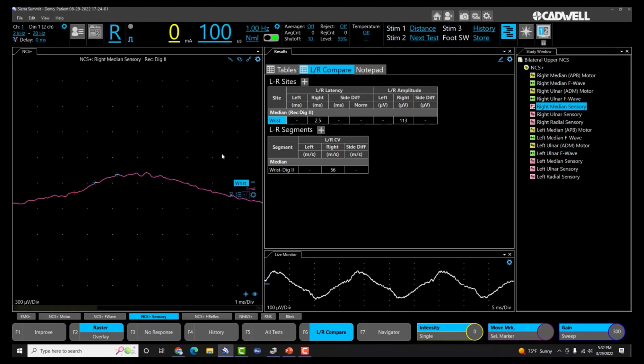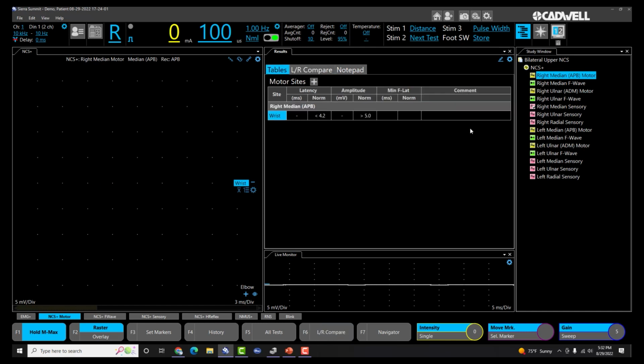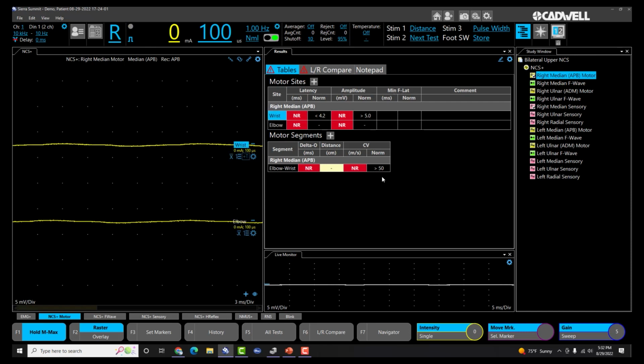And that was a brief tutorial on how to use edit mode to make customizations within the exam screen. The benefit of doing this is always so that you can test out all the changes you've made while you're in the test. So now that we've edited reference limits or changed our columns and headers, you can go ahead and collect data and make sure everything's showing up how you expect it to. And when you place cursors, you'll see all those changes reflected and make sure all the results are showing up how you want to see them.